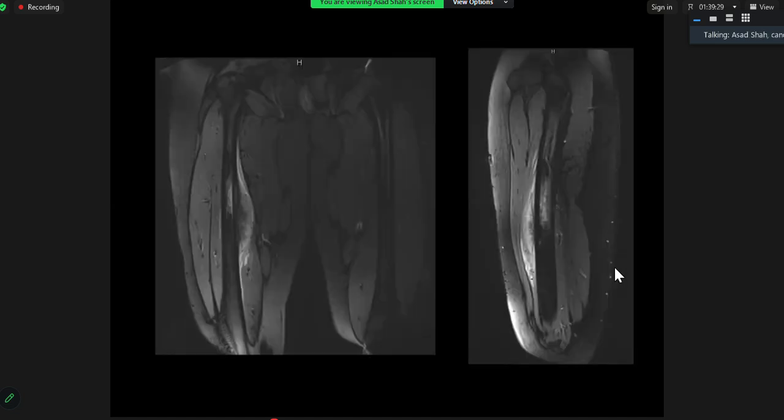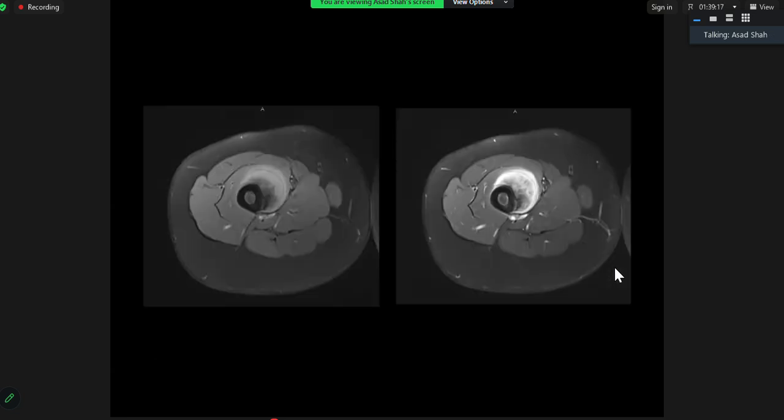If you see a lot of periosteal reaction, new bone formation, you have to think about a primary bone tumor. Do you know of any surface primary bone tumor? You said parosteal. Parosteal is usually at the back of the femur, isn't it? And it's like a lump of bone, isn't it? This doesn't look like a lump of bone, like you said. This is quite a large extraosseous soft tissue component with bone. This is all bone inside it, right?